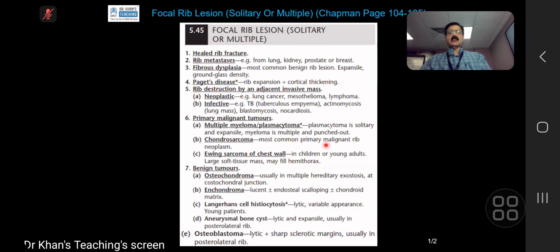Any bone, particularly in this age group, infection and Ewing's, blindly you should talk about them together. And of course, on a plain film, you cannot commit how much is the soft tissue component. So aggressive lesions, infection and Ewing's, they go together. Please also remember, even clinically, they go together, because Ewing's can present with infection-like symptoms, actually. Raised ESR, fever, etc. So in this particular case, the differential diagnosis is the key thing.